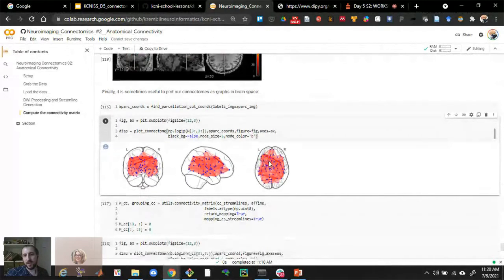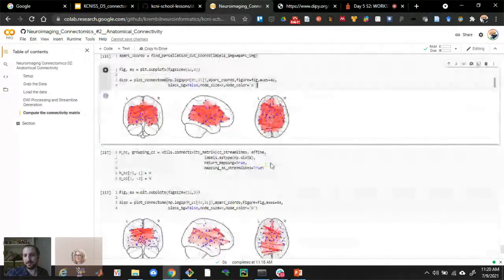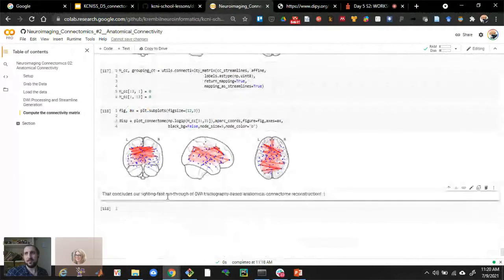But again, whether or not it's useful to do a three-dimensional plot depends on what you're doing. They certainly look good when you do them with slightly fancier visualizations than this. I would say more than half of the time they're visual window dressing, which has pros and cons.